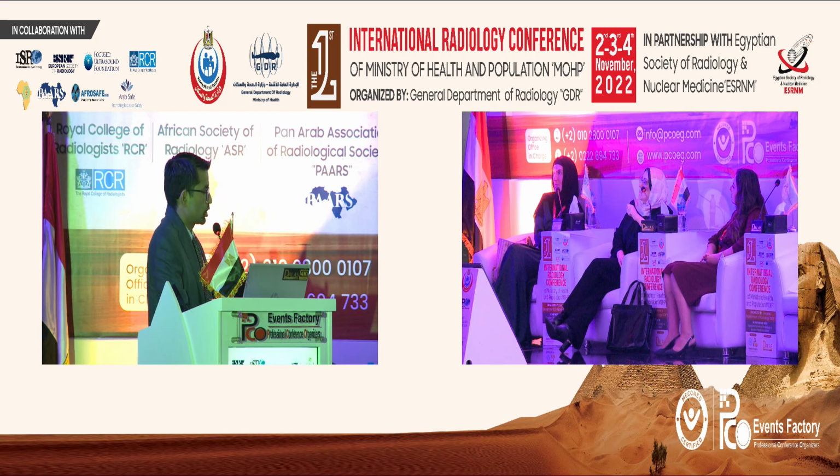And then I always look also for the apical and posterior mesh, and I'll show you in the next lecture, going from the sacral promontory to the vaginal apex, and then also in the ischial-rectal fossa. If you can look in those three places, 90% of cases you'll find it on the MRI. Ultrasound is a little bit trickier because it requires training of the technologist as well. Okay, thank you very much.